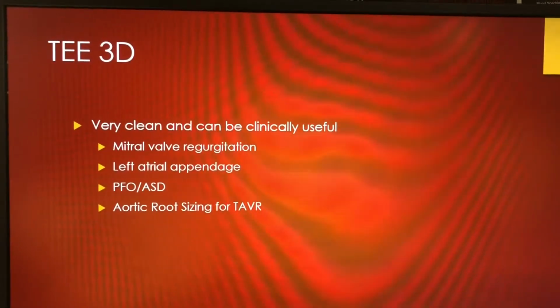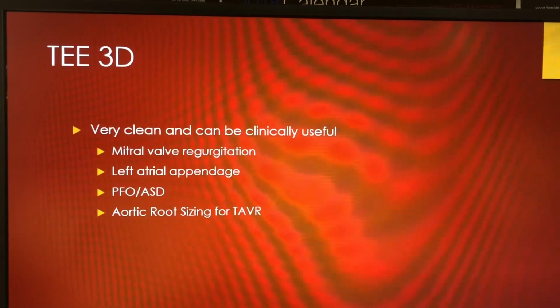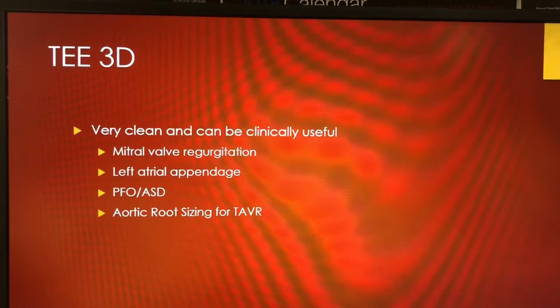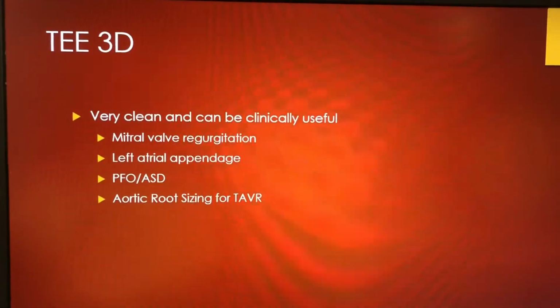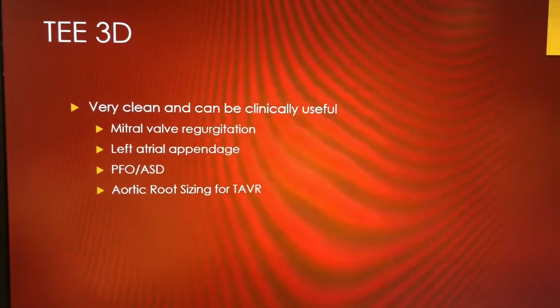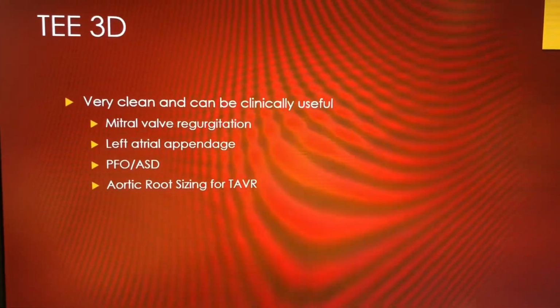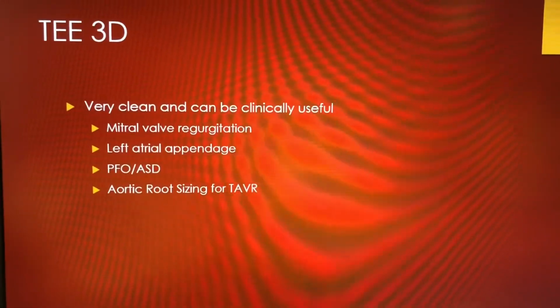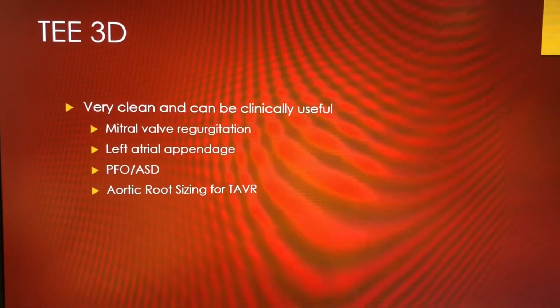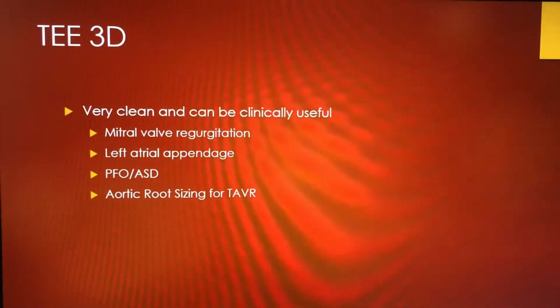When you know that information about mitral regurgitation, just how bad the valve is beat up, that helps them plan their surgery accordingly: can we put a mitral ring in this and fix this? Or is this not possible, and we have to go with a surgical approach and do a full mitral valve replacement?